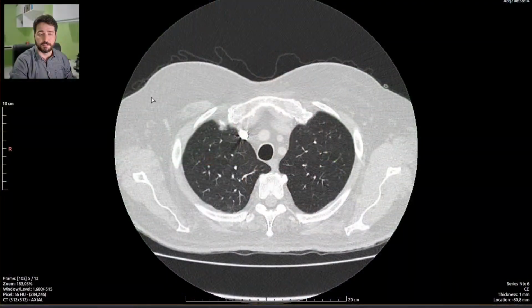So it's downloading quite fast, less than 1 minute to go. Let's grab ourselves a template for this exam. I have templates for every exam and some variations to make it easier and faster to report. It's done. Let me just share my screen so you guys can actually see the images as I roll them. So this is it.